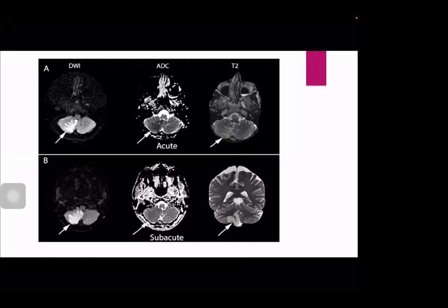low signal intensity region of the right cerebellar hemisphere.